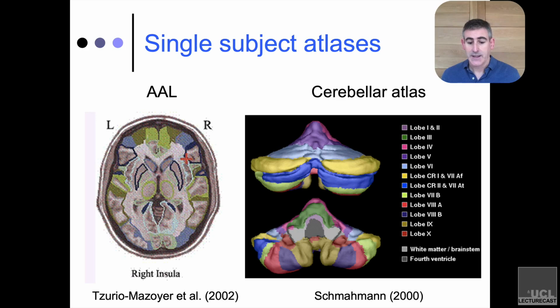And it's a really, really good way to start looking at your anatomy. Because although it isn't going to be perfect relative to your data, it's at least much more representative of the general population, because it's one brain that's been normalized to a population template.